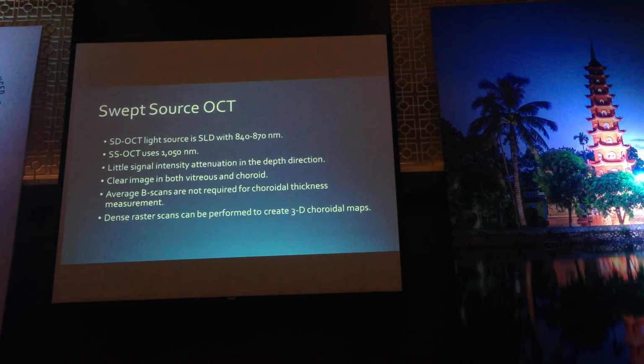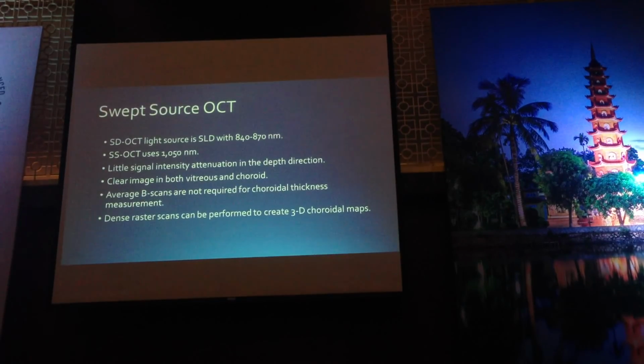To visualize the choroid, you can use the enhanced depth image, or if not, you can use this new hardware. For enhanced depth imaging, you just use the SD-OCT to do that.